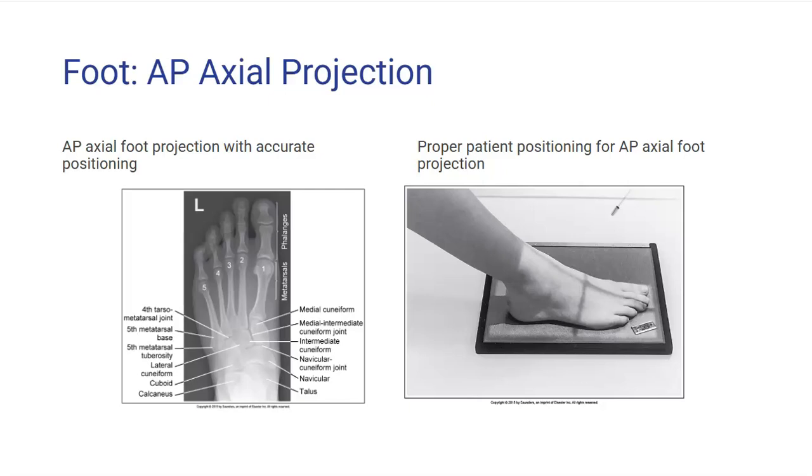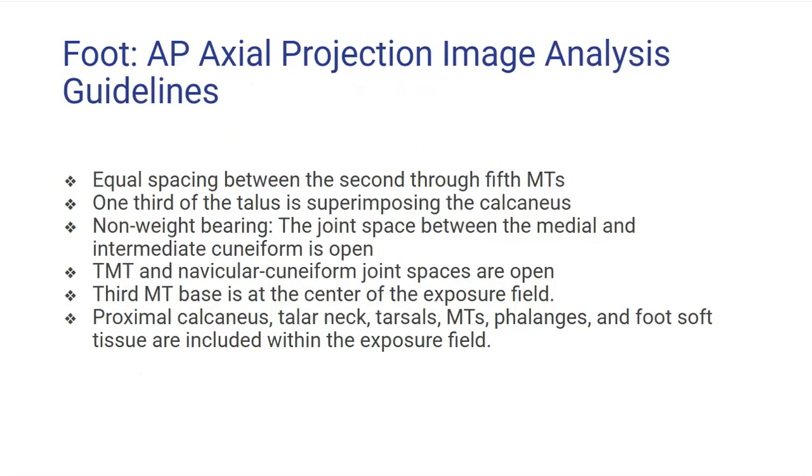The proximal calcaneus, talar neck, tarsals, metatarsals, phalanges, and foot soft tissue are all to be included within the exposure field. Here are those image analysis guidelines for your review.